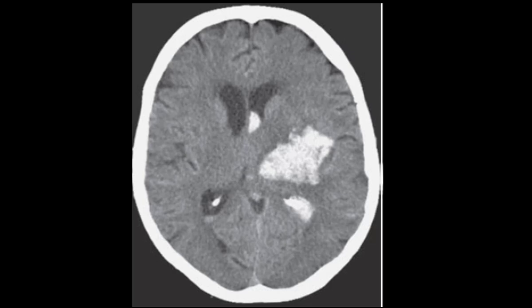Any comments? Which area is this? Thalamus. So this is a thalamic bleed with intraventricular extension.